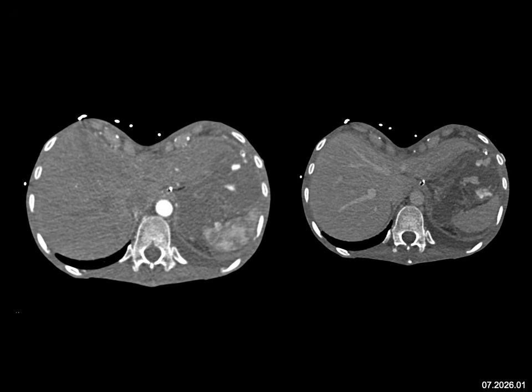That's active bleeding. Now, sometimes you get fooled in the stomach. There's some retained food matter, but it's going to look the same on arterial and venous phase imaging. Here, the difference in density and the expansion is consistent with the bleed.